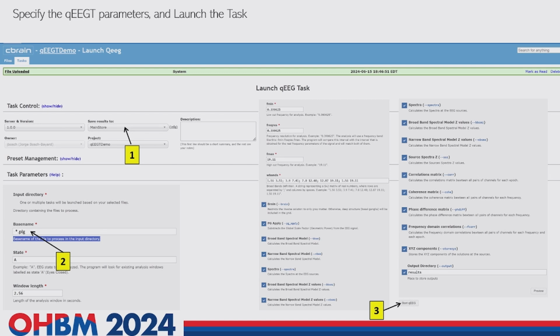And then, in this case, I am using files that are in PLG format, so they were recorded with our equipment. In the case that you use your text file, for example, you put here text. Or if you use BIDS files, you put here the name or the wildcard of your cases.